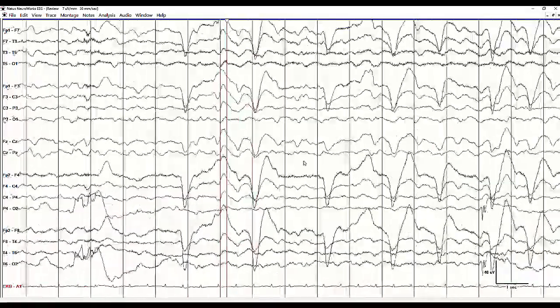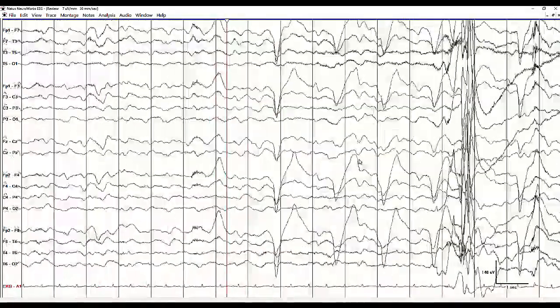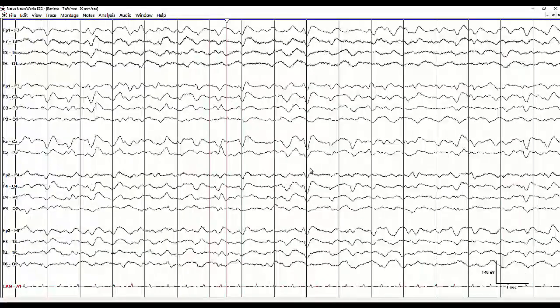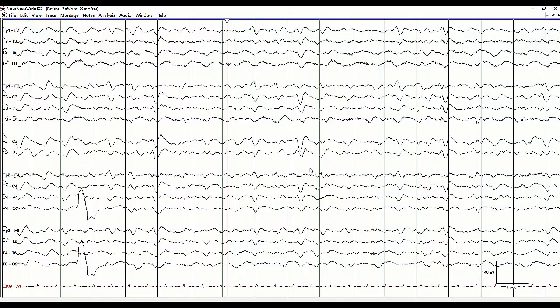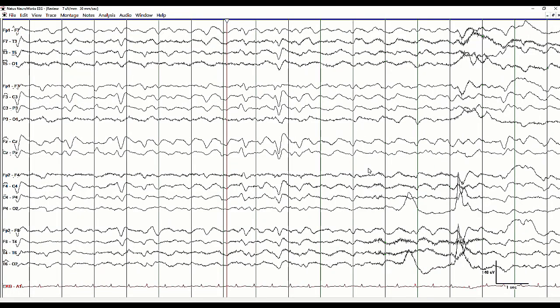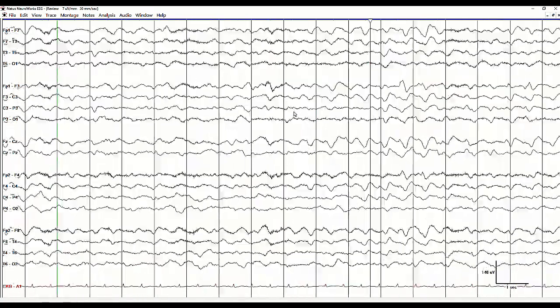And this EEG, which was recorded for approximately 25 minutes, is more of the same of this. So we have this low voltage underlying theta slowing with some delta, of course, right? Because we have the GPDs with triphasic morphology at approximately 1 to 1.5 hertz. At times, though, kind of hybridizing with GRDA, for example, right here. And they are both thought to arise from the same pathology. So that makes sense that you oftentimes see GRDA and GPDs with triphasic morphology together.